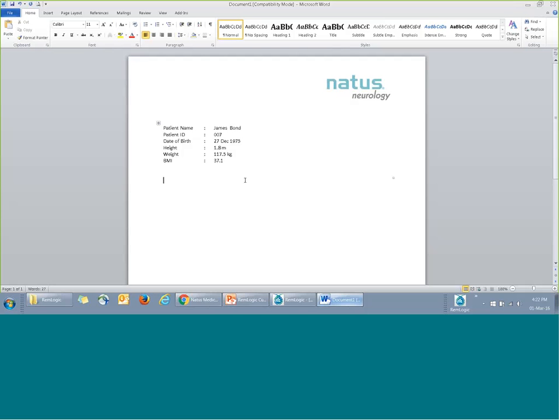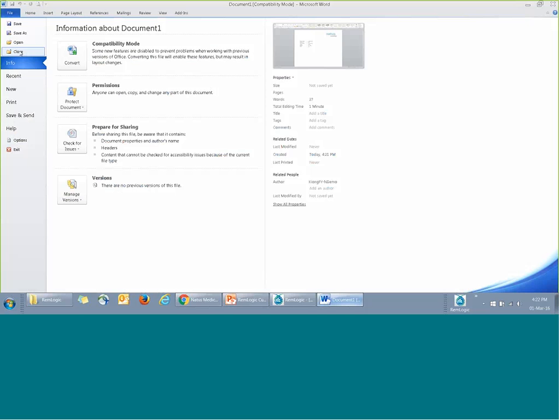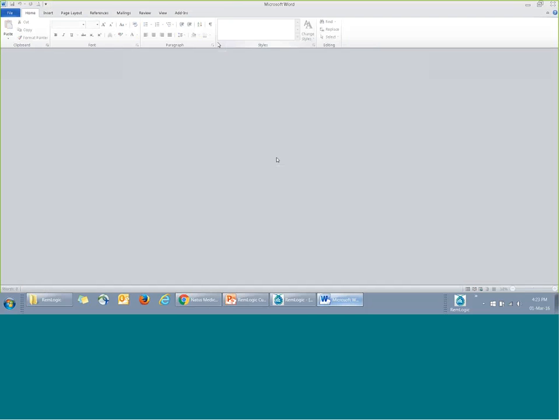Always remember, do not make any changes in this generated report. From my personal past experience, sometimes I've seen an error on the generated report. I would just make the changes here, and the part that I changed was working, but the rest of it was replaced with data. All the customized report codes were replaced by data. So do not make any changes here. If you need to make changes, always save as a second or third version, so that you do not replace the version that is working. Okay, so I'll close this generated report.